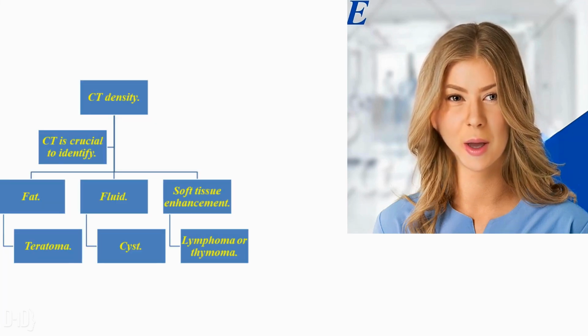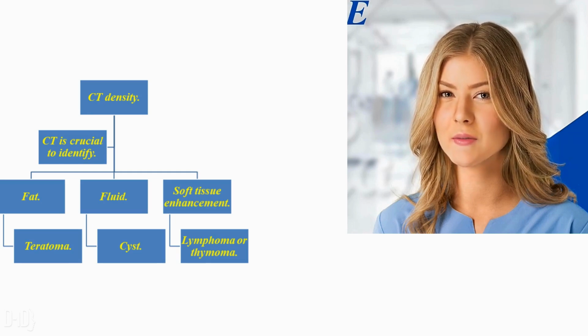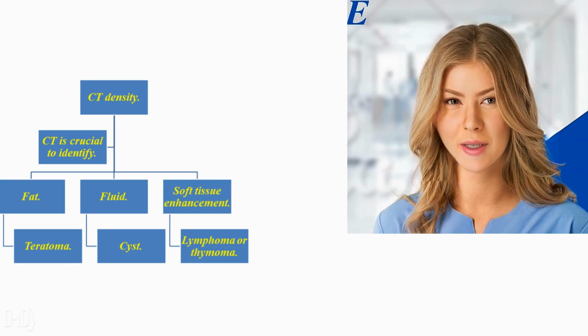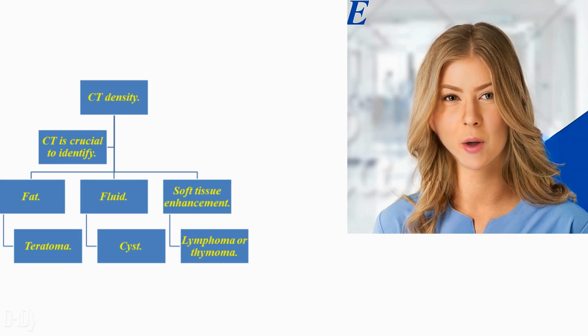Do not forget the main sign for differentiation, which is CT density. If the density is fat, diagnosis is teratoma, while if it is fluid, diagnosis is cyst. Finally, if it is soft tissue enhancement, it will be lymphoma or thymoma.